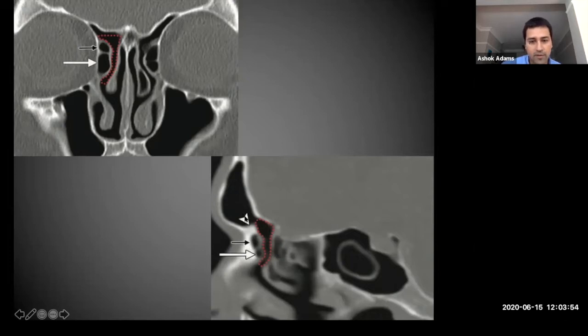When I start with the frontal sinus, this is the relevant anatomy. In this patient, there is a nicely aerated frontal sinus. You have this frontonasal process, the inferior aspect of the frontal sinus, and here, the frontal sinus drainage pathway. Then I will typically just divide it into anterior and posterior frontal ethmoidal air cells. You have the various type 1 to 4 classification systems, but I typically just divide it into anterior and posterior frontal ethmoidal air cells. And in this patient, you can see a nicely patent frontal sinus drainage pathway.